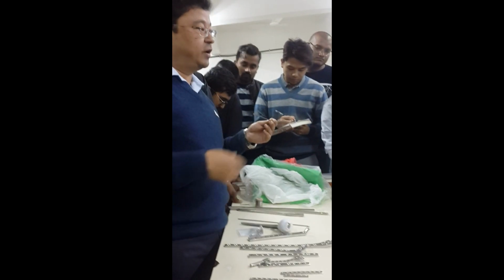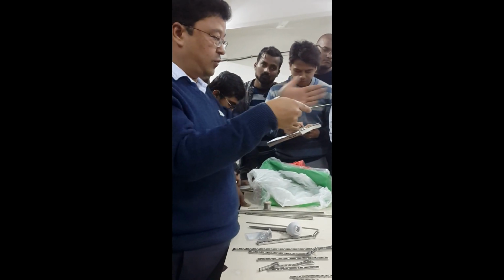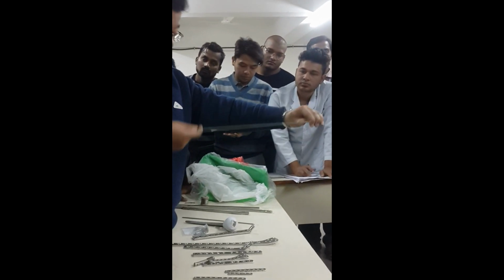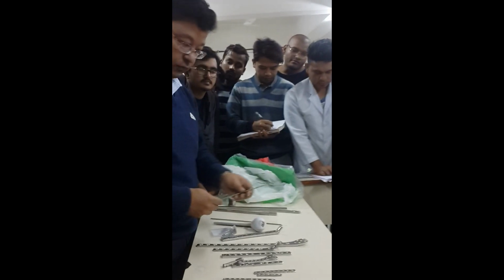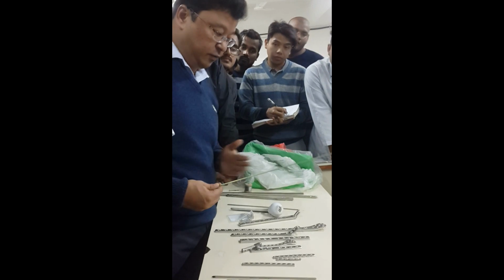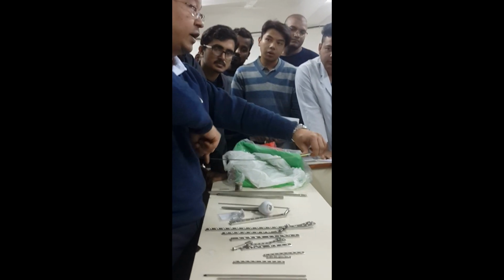This is used for forearm, humerus, femur and tibia, everything. You have to put two nails. One side is one, the other side is the other, and they cross like this. Suppose I put one from here, it will stay like this. The other will be bent like this and come like this. And the principle is three bony point fixation.